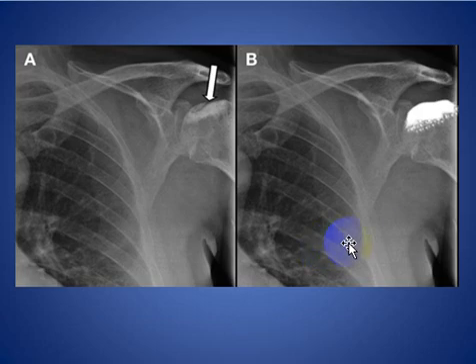Here, this patient with the snow cap sign, as we see here, density involving the head of the humerus in a patient with avascular necrosis giving the appearance of a snow cap. Also, we see here the head is flattened, in this patient with avascular necrosis.